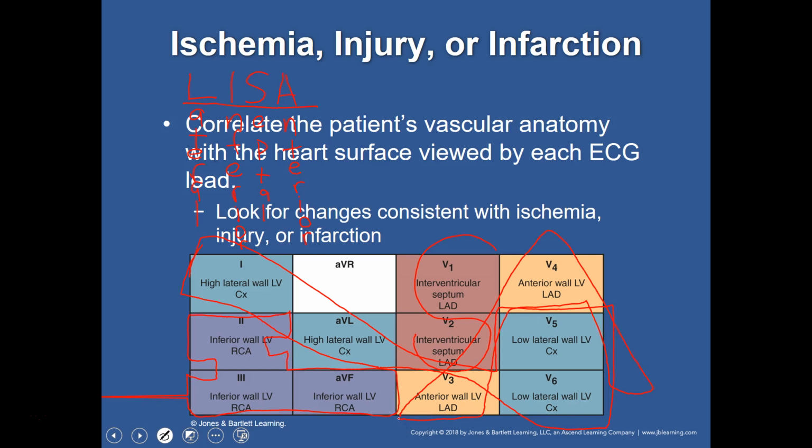So, let me break this down for you. This is Lisa. She's very nice. Lisa, L, right here, okay, L, I, S, and then A. What we're doing is when we look at a 12 lead, and what I did as a new paramedic, and even when I'd start forgetting stuff and have to review, is I would go through and mark my 12 lead with this marking. And what you do is you're looking for what?